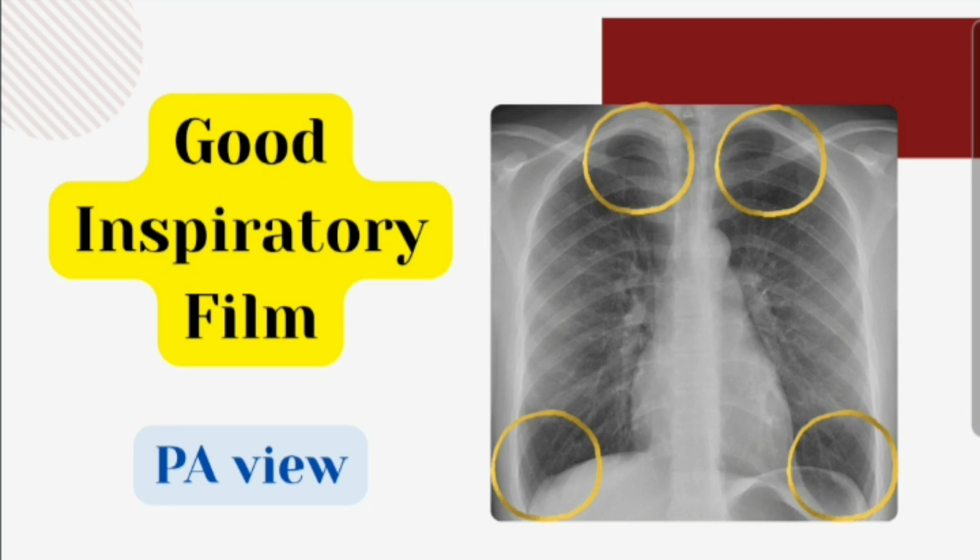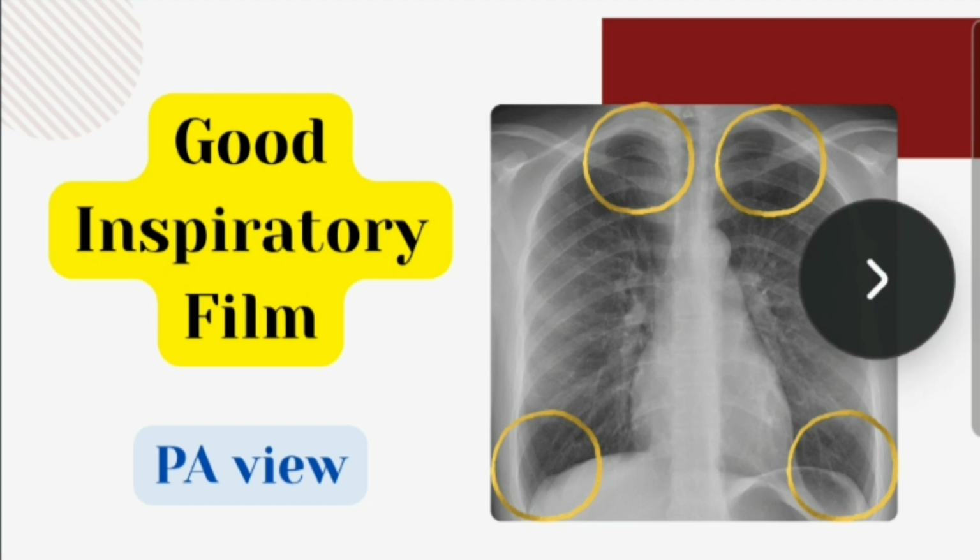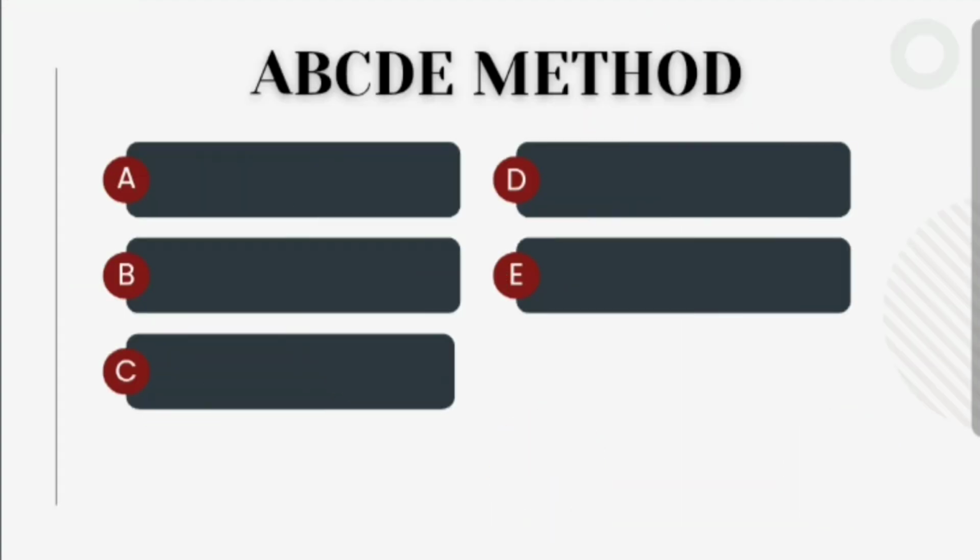A standard chest X-ray demonstrates features of PA view, that is postero-anterior projection. Chest X-ray AP view is performed when patients are unable to mobilize easily. Let me explain a clear systematic approach to the interpretation of chest X-ray.